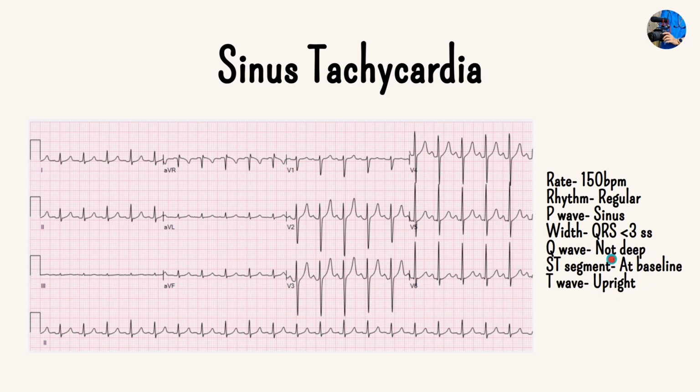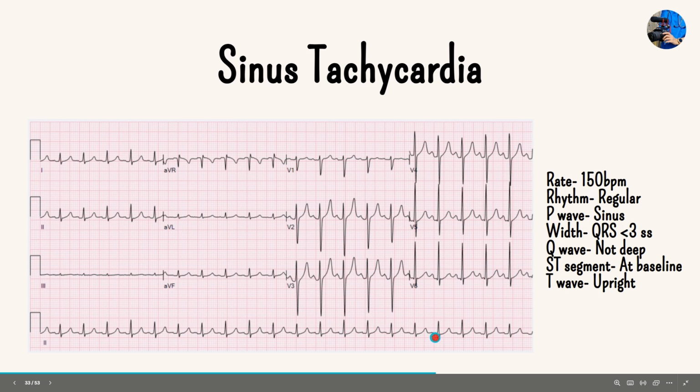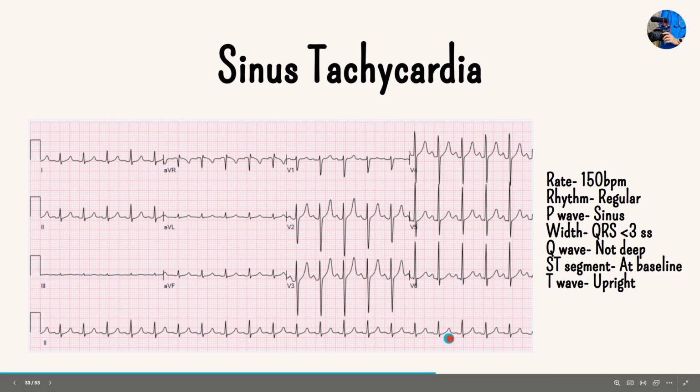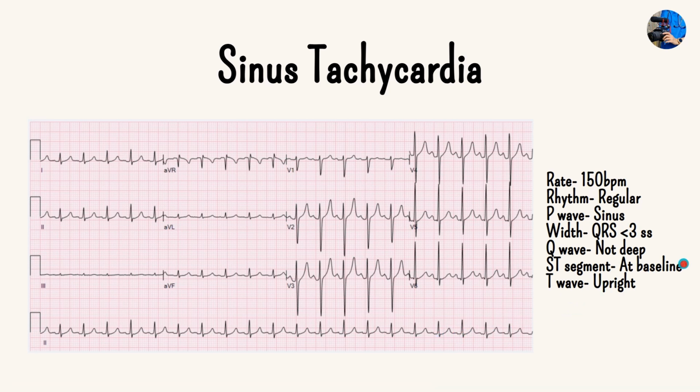ST segment, well, you can have a look at your ST segment here. You can see right here, your S wave was right here, coming up to the T wave. Well, that is pretty much at baseline. Baseline meaning at the isoelectric line of where your P wave is. And you can see that that's not raised. That sort of comes up nicely into your T wave. So we are at baseline, which is fine. And your T waves are nice and upright.